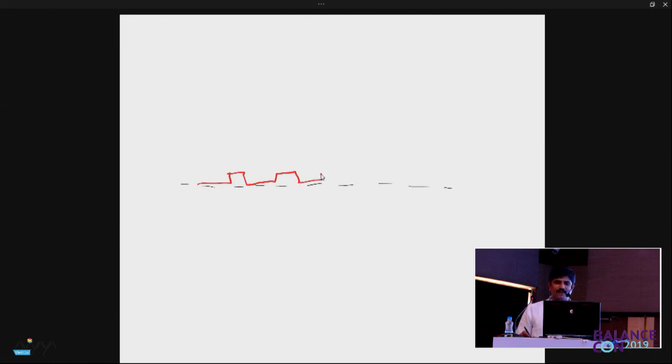It keeps coming back to the line of fixation. It spends some time there, realizes that it has missed what it is supposed to be looking at, then it comes back. This is a small saccade, there is a fixation event, there is another saccade back to its fixation point.